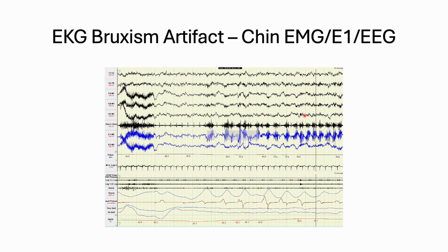There's a little bit of thickening in the signals here. And back here you can really see it. This patient did something here. It looks like they might be clenching there. So that's what that is. These little bursts, and it's in the eye as well.